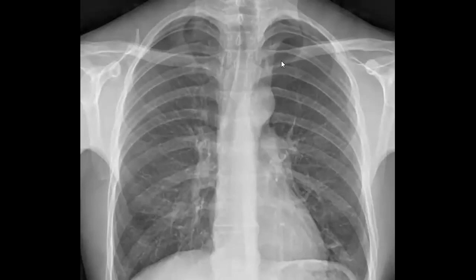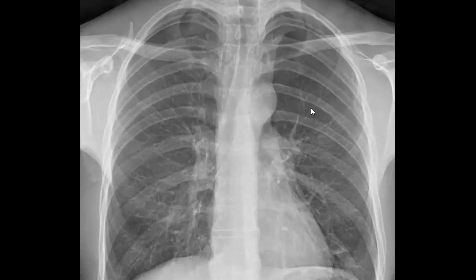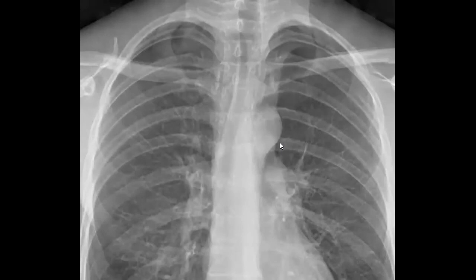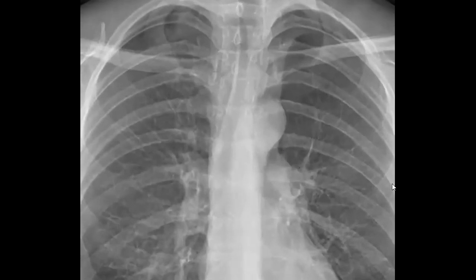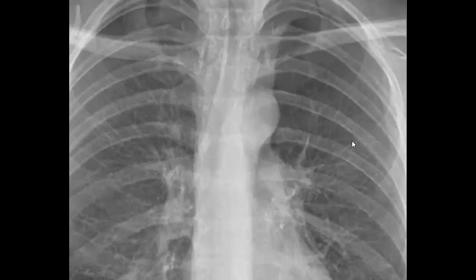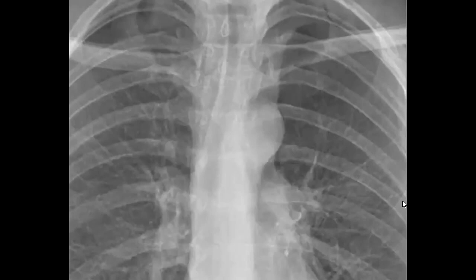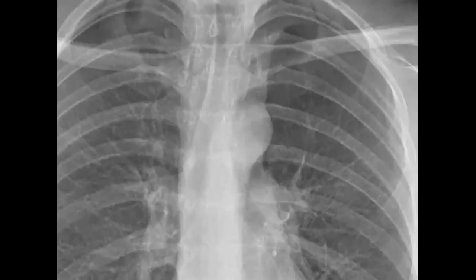The first case today was with the eagle's eye. I'm zooming until you see it. When you see it, tell me. If you don't see it, okay, neglect it. But if you see it, try to think about it, okay? Yes, you can find it. Yeah, this is the line.